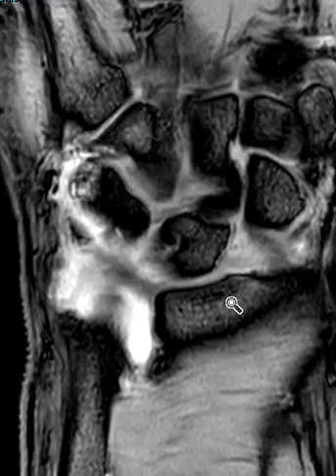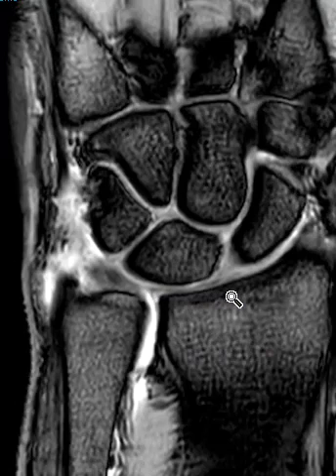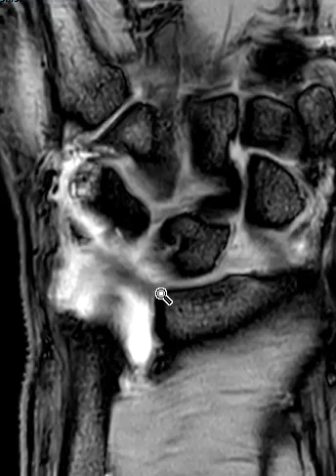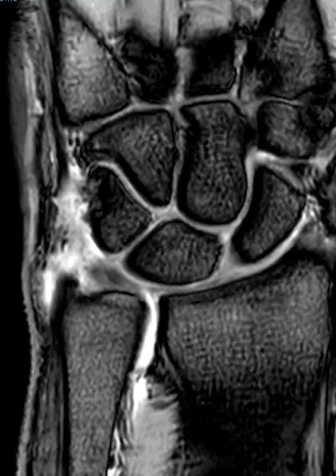If we go one cut along the palmar aspect, this is the palmar band. Now we're into that central disc that's torn. We're going to go into the dorsal aspect. Here's the dorsal band coming off the radius. So those palmar band and dorsal band look like they are intact.